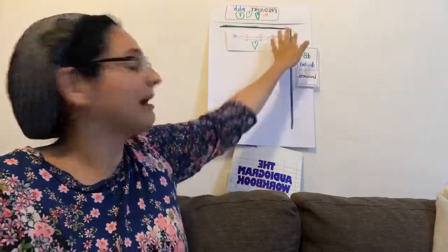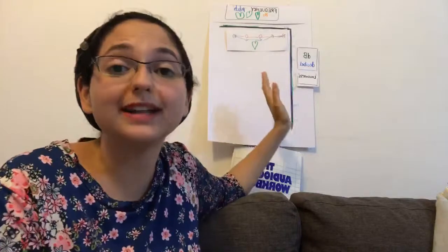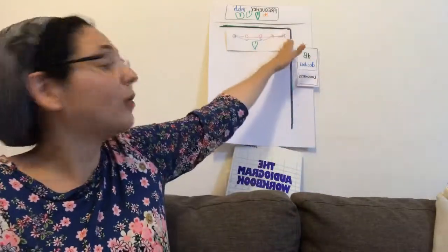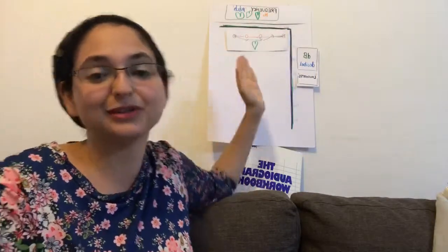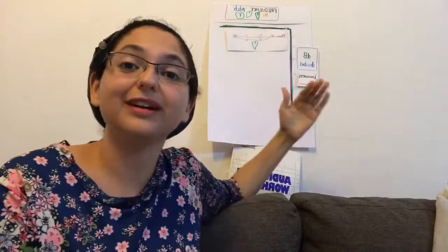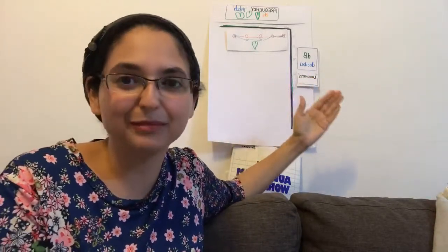And so right around 10, 15, even 20 decibels, that means that the sounds are very, very quiet and you're hearing them quietly at all the different frequencies, all the different pitches, low pitch sounds and high pitch sounds. You're hearing them all at the same low level.